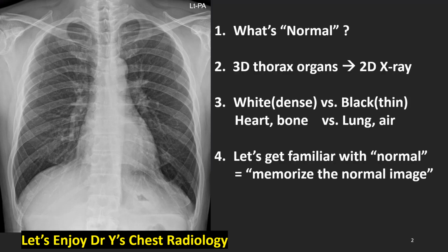As you see, this chest radiograph is a healthy young man without abnormal findings, so-called normal chest X-ray. We have to think about 4 things in this chapter. First, what's normal? Second, chest X-ray means 3D thorax organs expressed in a 2D simple plain X-ray image.